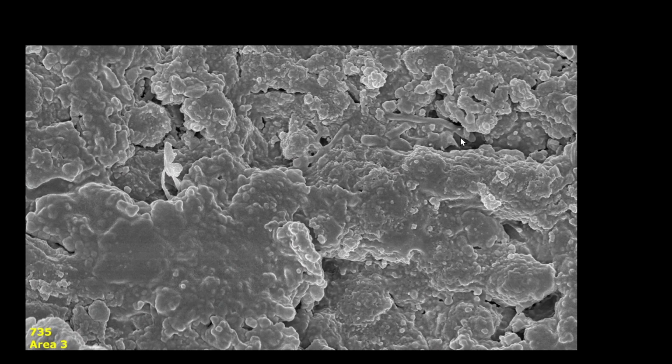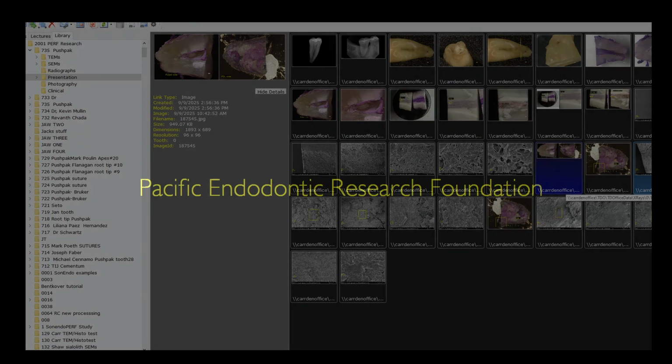So when you go into these areas, I believe what you see is a picture of a fairly extensive biofilm on the PDL side of the ligament. So I thought this was interesting and that you'd enjoy seeing it.